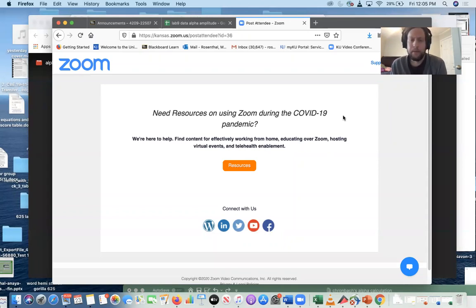But we will be making calculations of alpha amplitude using the software Biopac for both of those participants, and then we will be writing them into a Google Doc. So I'll show you how to do all of that in this recording. First, though, let me go to the slides.